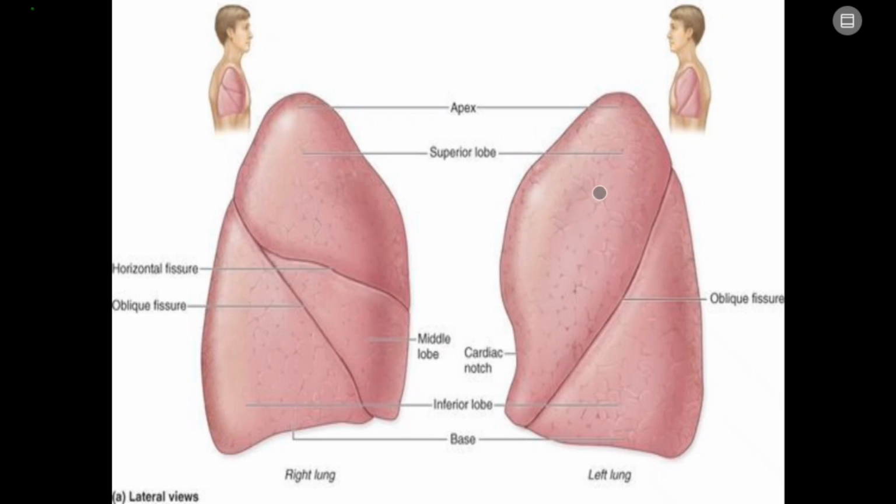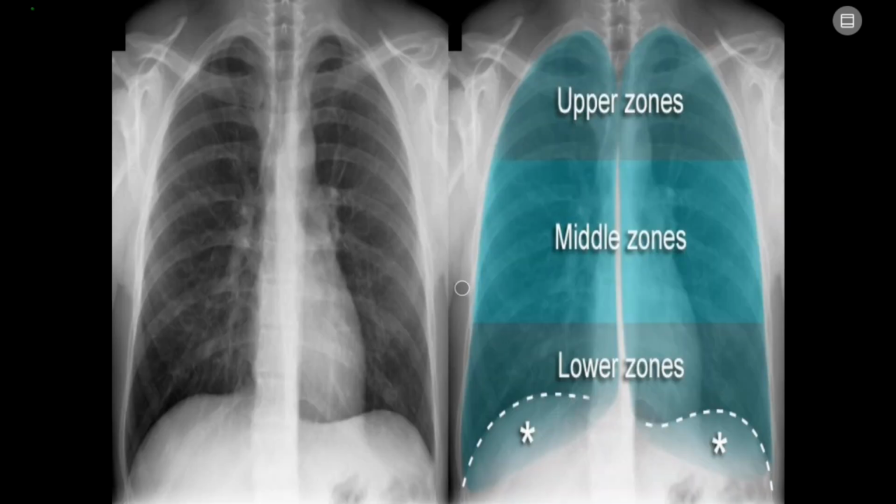This upper lobe is more anterior, and this lower lobe is more posterior and big. This is a lateral view of the right lung, divided into upper, lower and middle lobes by fissures. This is a major fissure and this is a minor fissure that originates from the major fissure to make the middle lobe.